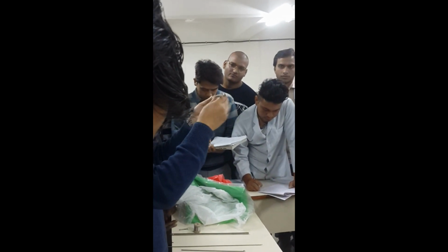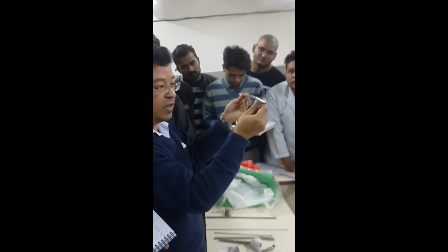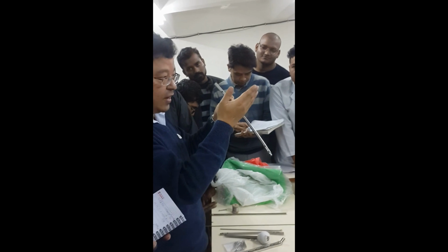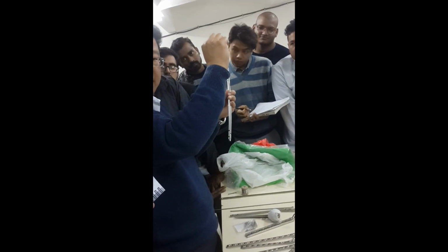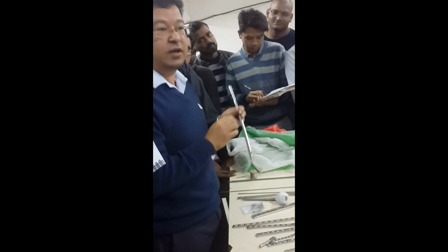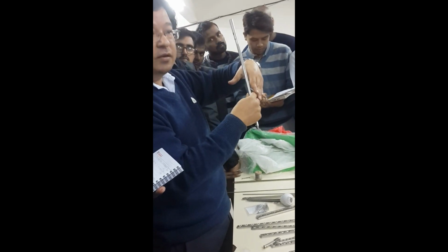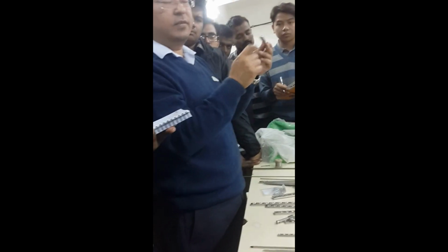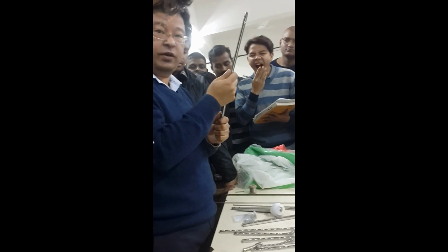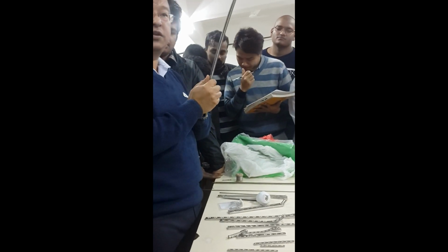If there is a comminuted fracture, you don't want it to collapse, so you put all four screws and lock it statically. But if it's a transverse fracture, you put a nail and if there is still some space, you apply two static and only dynamic here. When the patient bears weight, the fracture will collapse and there will be compression. It is for that. So static holes and dynamic holes: the dynamic is the oval one, the spherical is static. So this is the femur nail.